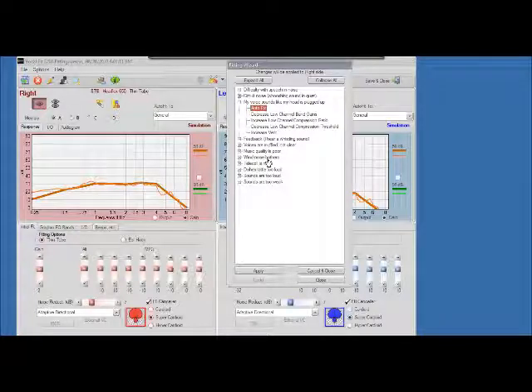If you hit AutoFix and you go down here, for every time you click Apply, you will see over in the response curves the changes that are made. And every time you click Apply, it will step each of these options one step at a time. You may undo as many steps as you have applied in the first place.